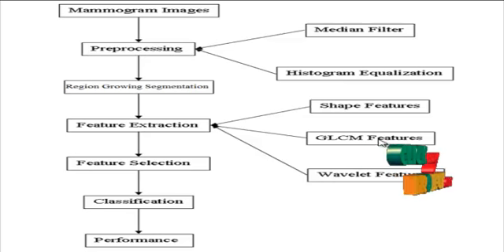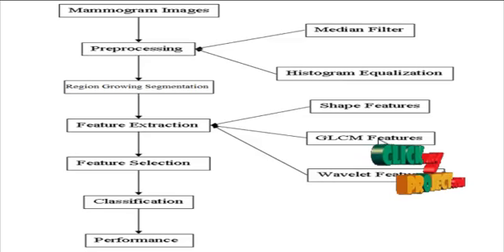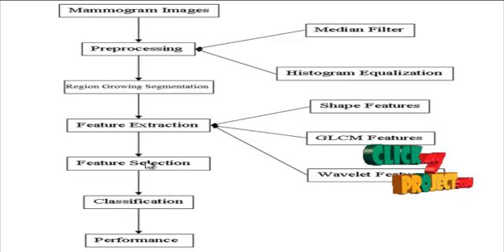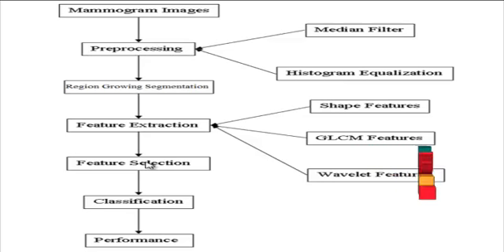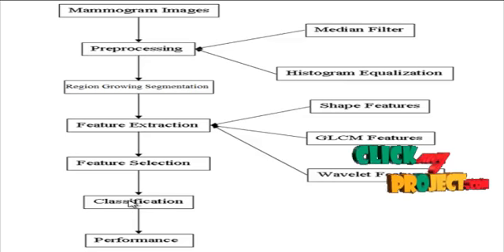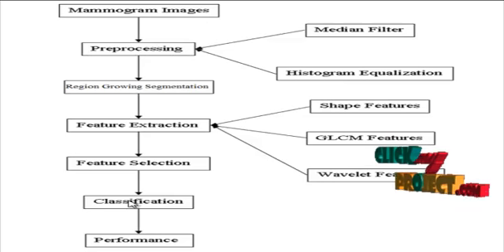Based on those feature extraction values, the values were completed, and after that the selection process is employed. In the feature selection process, the selection is employed based on PSO optimization methodologies. In optimization, the number of features were selected based on the best fitness solutions calculated. The extracted feature values were then subjected to classification. Here for classification, neural network measures were employed, and for comparison, KNN is taken.